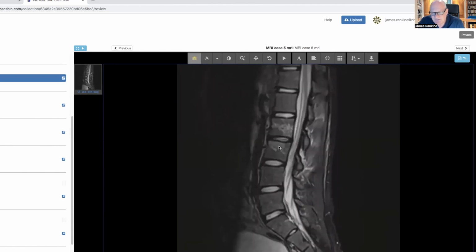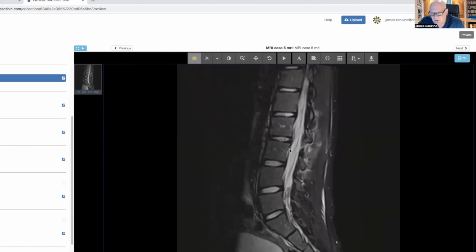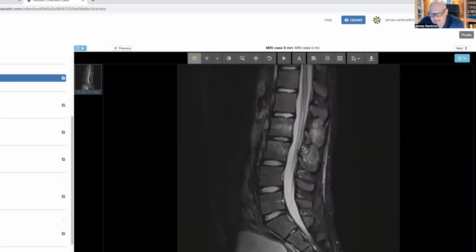And what I also anticipate is that the ligamentum flavum will be ripped on the left side, which it is indeed here. But as I go towards the right side, I can see that it's intact. So the instability here is going to be one of the patient tipping over to the side rather than tipping straight over in a true flexion distraction injury, because the ligamentum flavum is intact on one side.